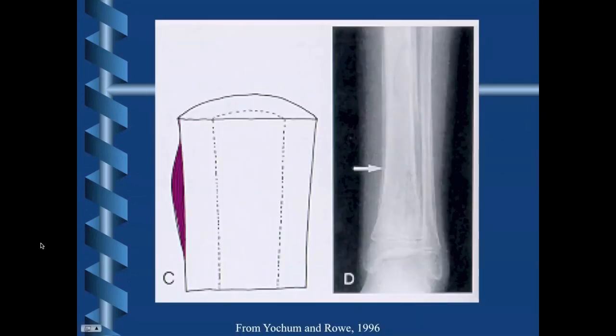So this is the appearance. If we look at the red periosteal response over here, we can see the layering, which is similar to the insides of an onion. If we look over here, we can see a widespread lesion within the tibia with imperceptible margins.